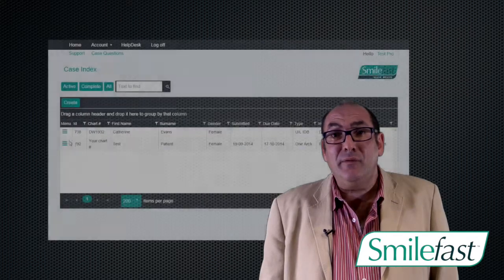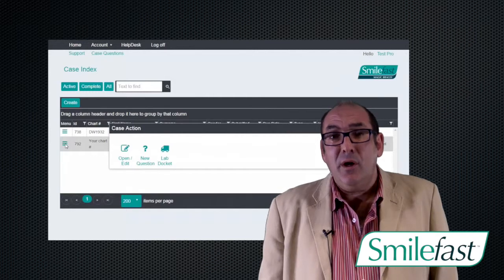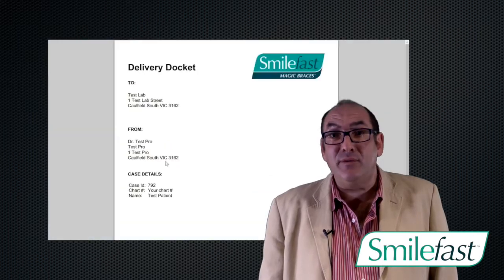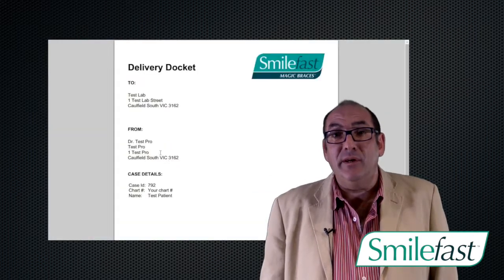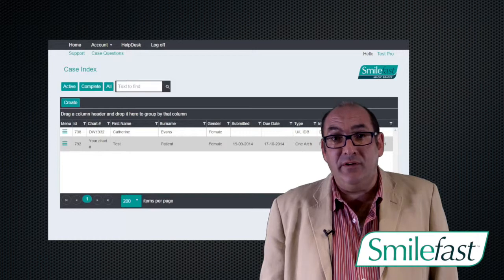If you have taken a PVS or physical impression, you then go back into the patient's chart on the edited open screen, and there'll be a docket there which says lab docket. You need to print that lab docket and place that with your PVS impression and send it to the lab which is listed on that lab docket. Now you've completed all that you need to for the process, and we will start the fabrication of the digital setup.